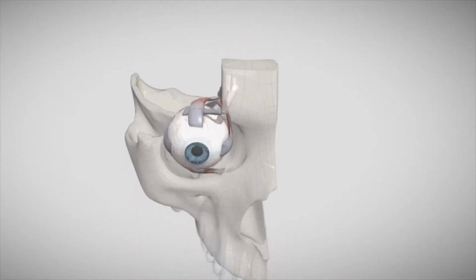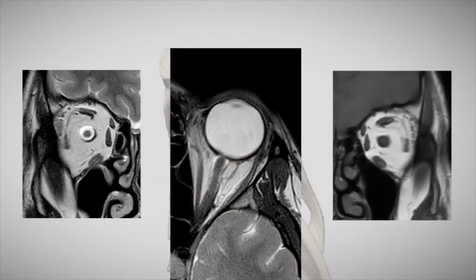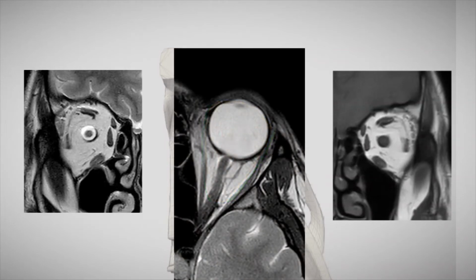The location of orbital structures is best understood by dividing them into different compartments. Intraconal space. It is the space surrounded by the four recti and intermuscular connections, housing the optic nerve and its sheath, seen best on axial view along with add-on coronal views. Extraconal space. Best visualized in coronal sections, this is the space between the muscle cone and the periosteum of the orbital wall and anteriorly limited by the orbital septum.